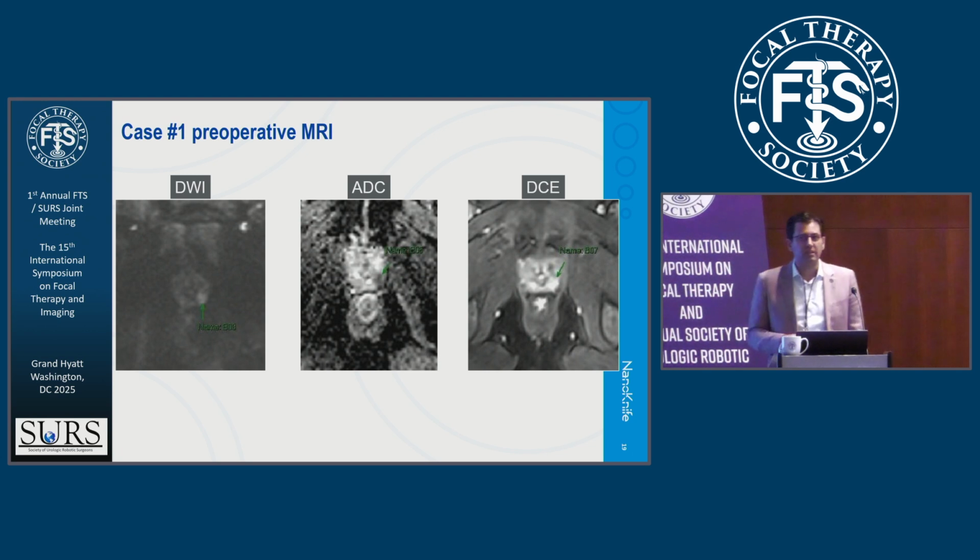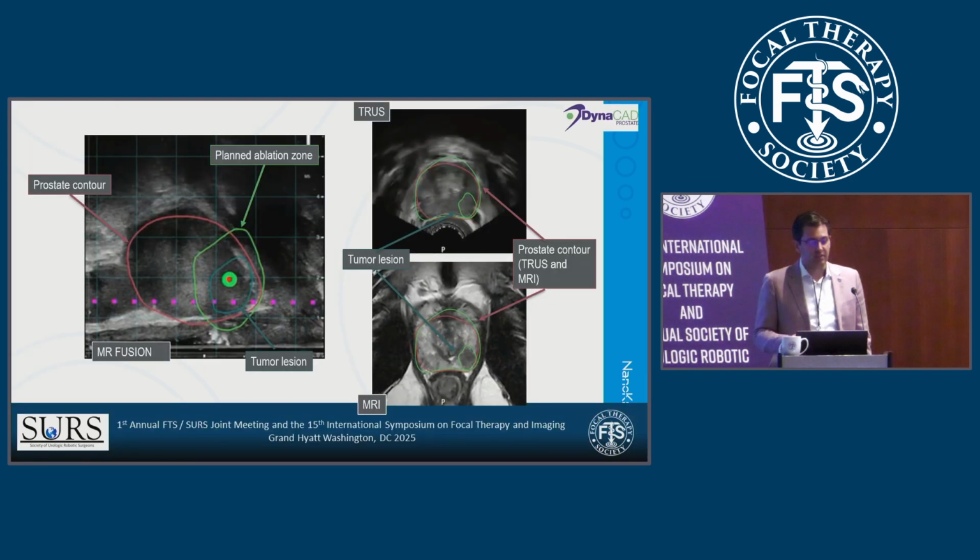I really use the DCE when I plan. Your radiologist might segment and target for the indication for a biopsy, but planning for focal is different. So please remember that. We went over that this morning. This is just an example of how we localize the lesion for focal therapy. We have a planned ablation zone. This was done by hand, thanks to Dr. Marquis, who helped me prepare the slides for this. And this is an IRE case.